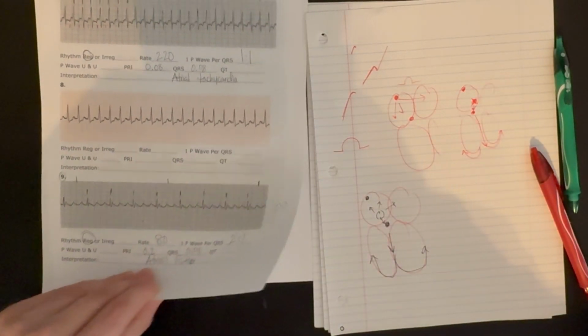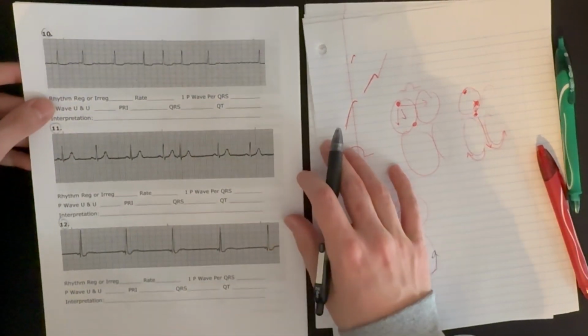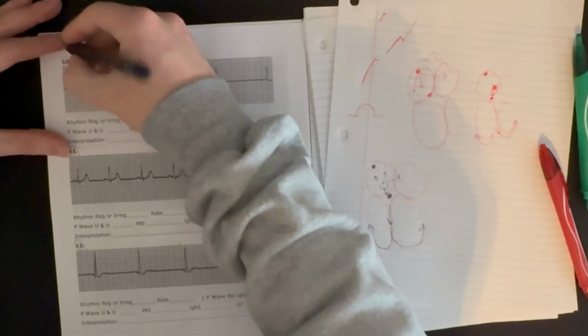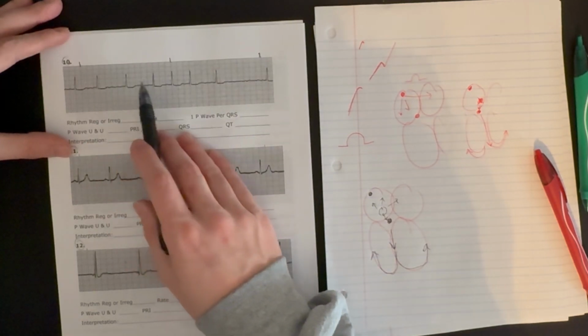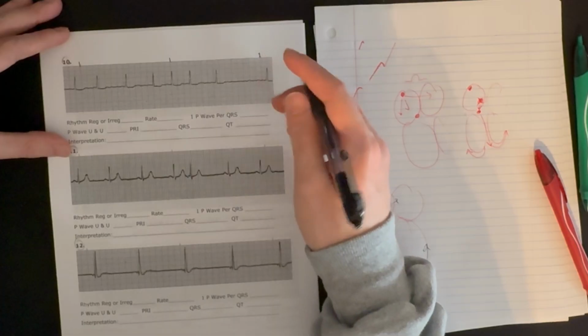All right, let's take a look at number 10 right here. So count our rate: 1, 2, 3, 4, 5, 6. So about 60.